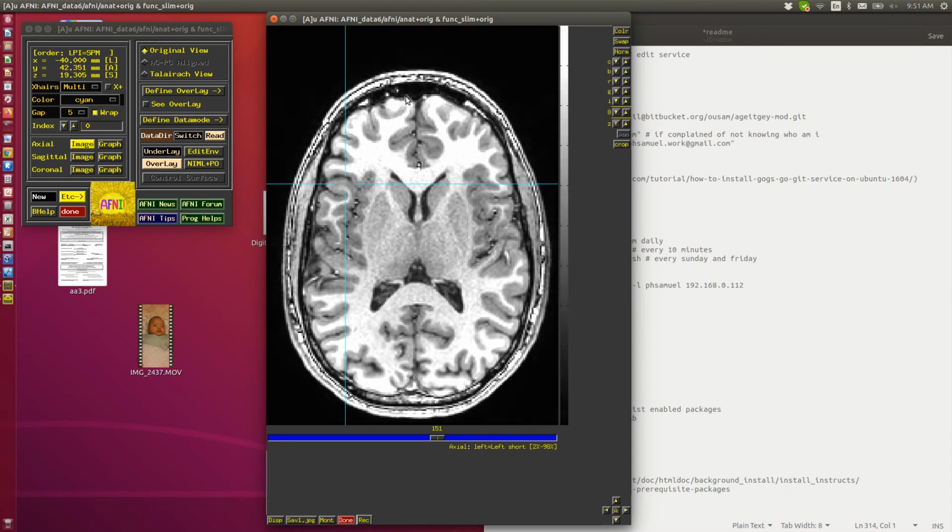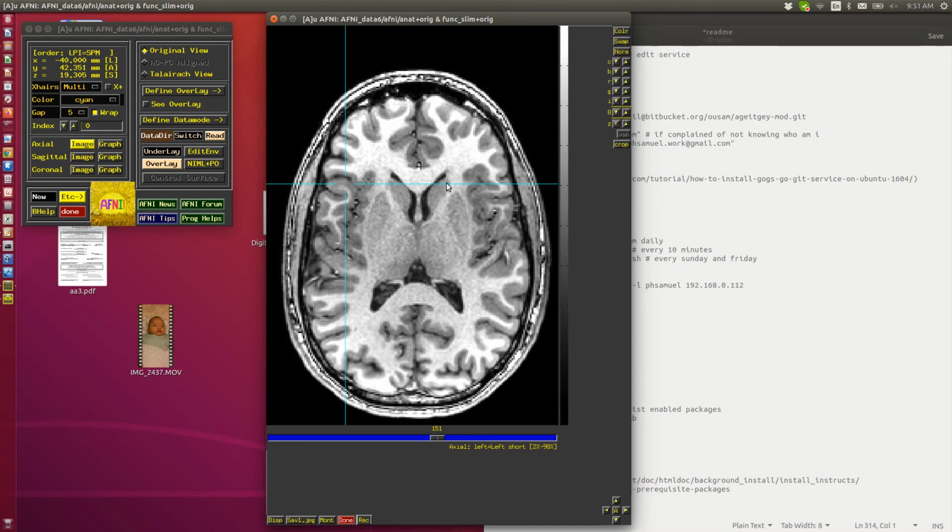Now maybe I should drag it around so it looks good for you, not for me, because the contrast on the screens is somewhat different. There, that looks pretty good. Drop it. Just unclick when you're done. So it's the motion. If you click without motion, then that means move the crosshair. If you click, hold, and move, it does something completely different.